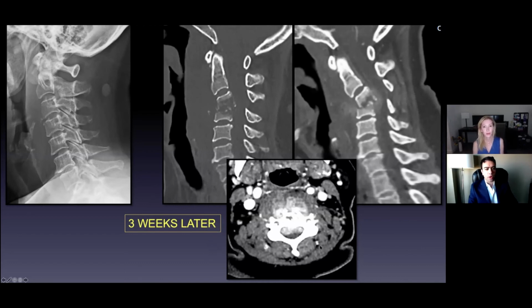As you mentioned before, you can see this patient has very significant prevertebral soft tissue swelling, okay? Now, very rarely can this compromise the patient's airway. So the first thing I look at is the trachea in front of the soft tissues. You can't see my pointer, but you can see that it's totally patent, right? So this patient's not having any breathing difficulty. That's good. The patient's airway is secure.